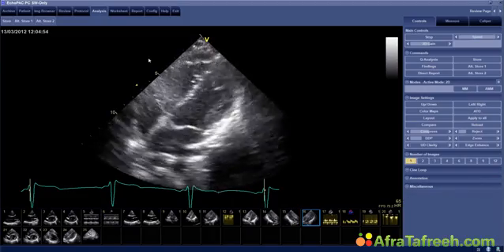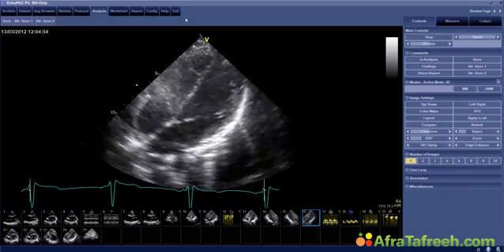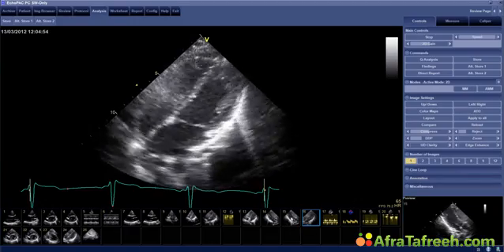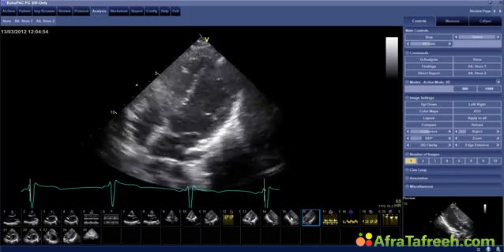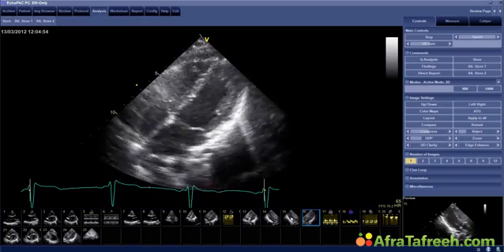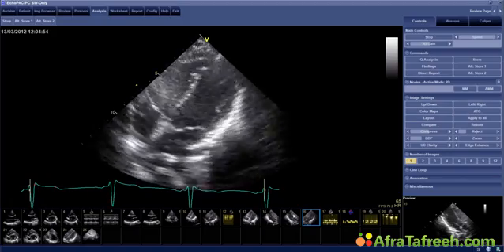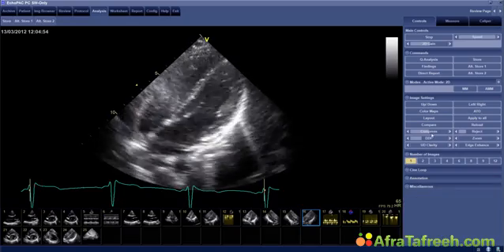Yvonne just asked a question about the pericardial effusion. Well, I would think it's a mild to moderately sized pericardial effusion. And in this case, aside from the fact that the patient has a questionably normal or maybe abnormal left ventricular function, we'll come to that later, the pericardial effusion might mean something else, namely that the patient could have a pericardial involvement of the primary tumor. Okay, so now let me ask you the question.